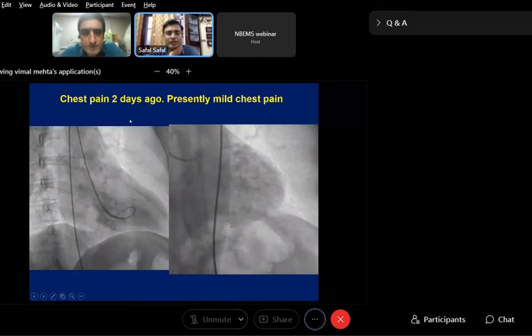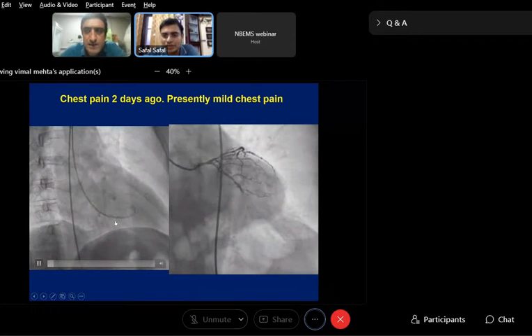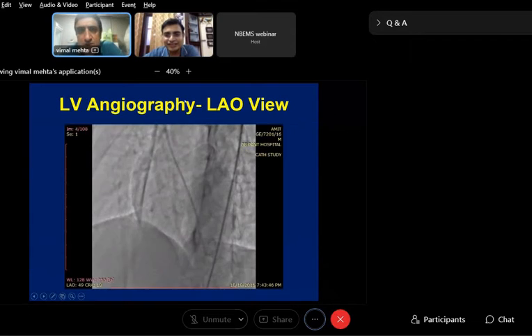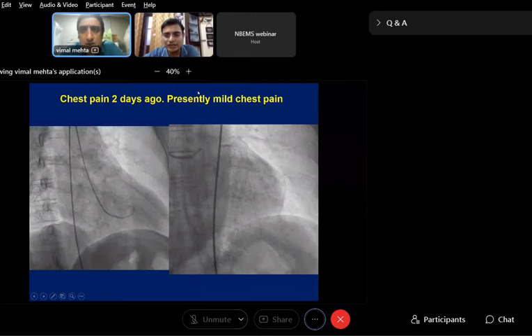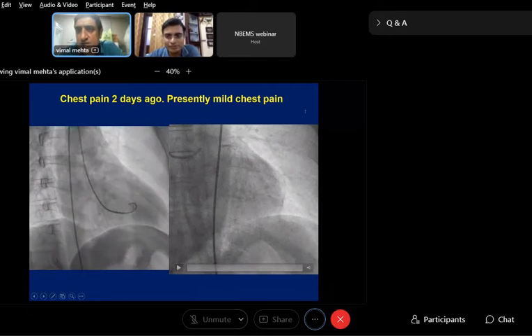Apical aneurysm, LV apical ballooning, they have typed in their responses. Okay. Why am I not able to see the response? Yes, some boy has now typed basal hypokinesia. Yeah. Apical ballooning, apical aneurysm. Okay, somebody is typing actually. I'm not seeing it. Okay, yes.